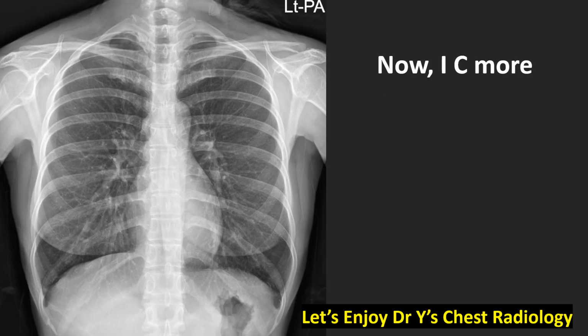Now I see more with this film. Now we see more with this young lady's film.